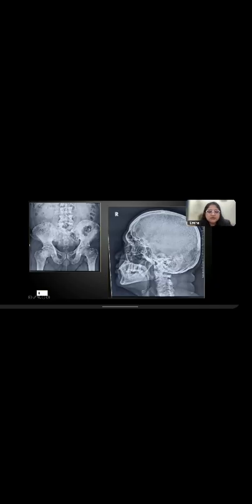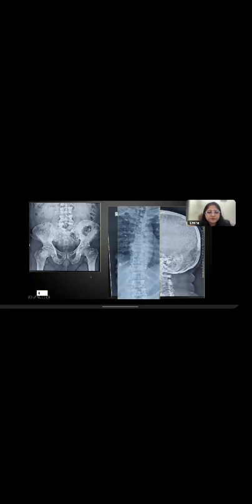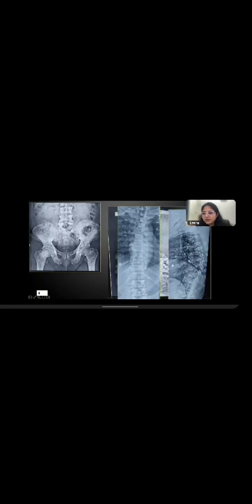So this is a patient, around 65-year-old patient with CA prostate, and these are large sclerotic ill-defined metastatic lesions in the skull also and in the pelvis, also in the spine. This is how his rest of the spine looked like, lytic lesions and mixed lytic and sclerotic lesions all over. I'll move the chat box so you can see. This is how his spine was looking, and there was compression fracture also seen in few of the vertebrae.